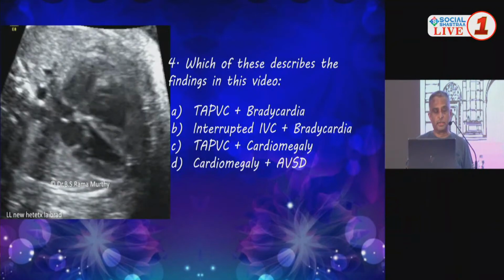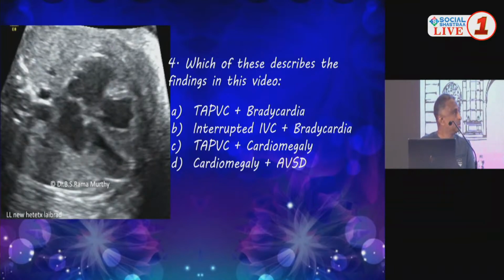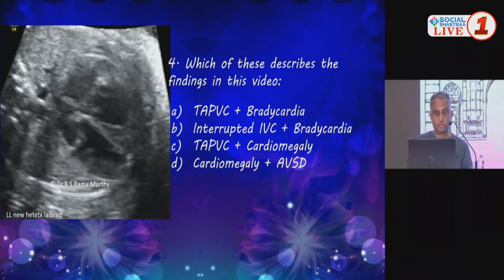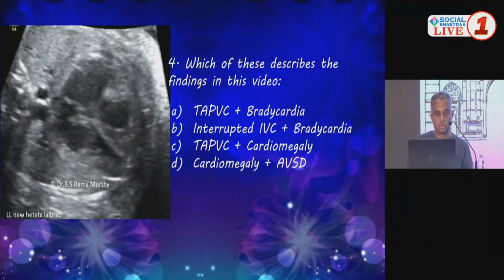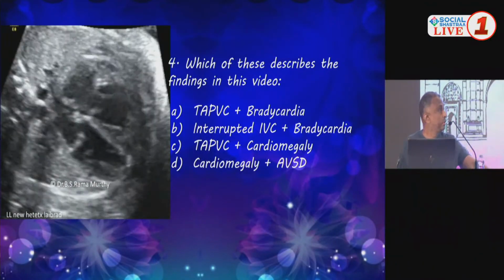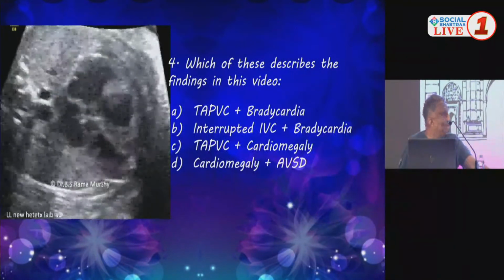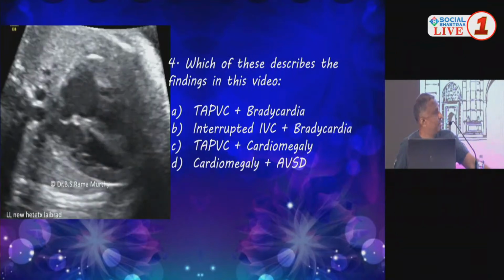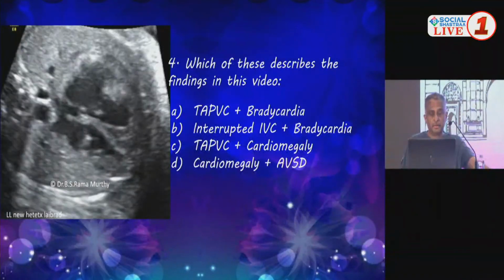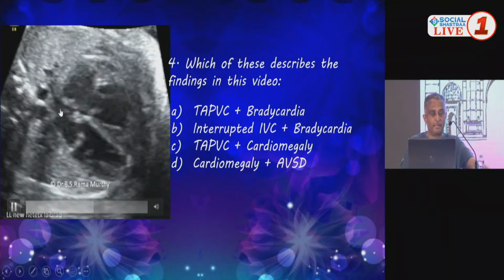Okay, you can start the timer. B is right, but only 18% correct? Yeah. Now, the answer to this lies in the area behind the heart.